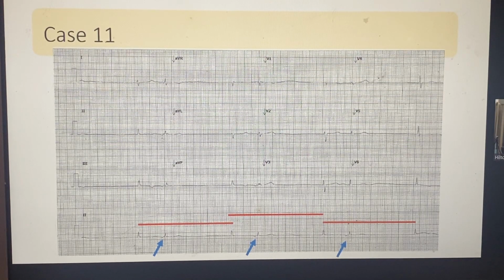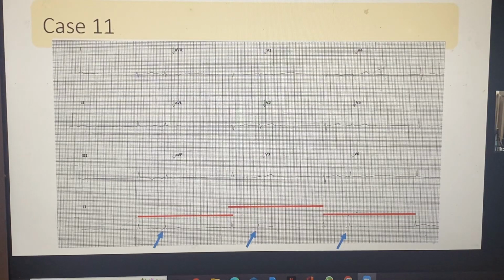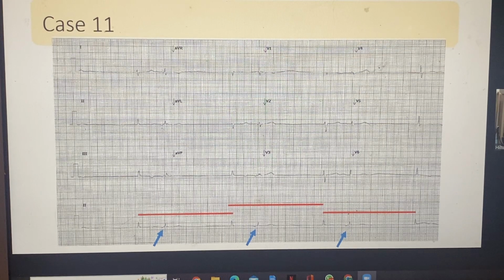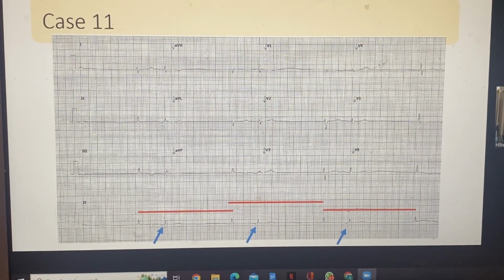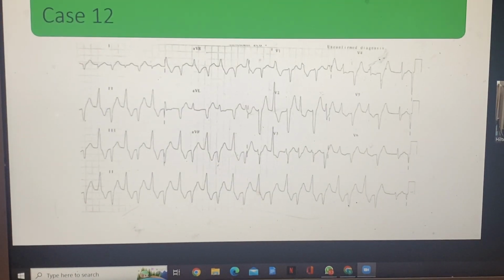That's what I feel. But I think the point is to move away from re-entrance, because we would expect at least some manifestation of a concealed or manifest accessory pathway. But again, it's very hard to determine by just looking at a surface ECG unless we can have a CS catheter. If we're going to have an echo, for me, I cannot answer that to be honest. Yeah, I don't think this one is strict, but it's a good thinking process. Okay, so maybe next I'll pass to G.